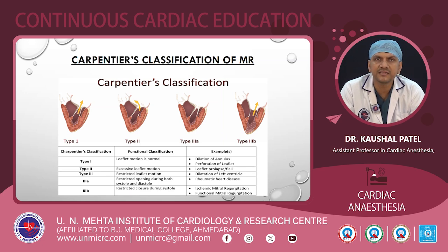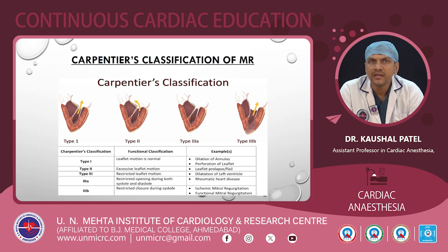Type 2 is excessive leaflet motion, like leaflet prolapse and flail, in which the patient presents with acute MI and there is a rupture of the papillary muscles or the chordae that can cause leaflet prolapse and flail, which presents with MR. And type 3 is restricted leaflet motion. It is divided into type 3A and 3B.